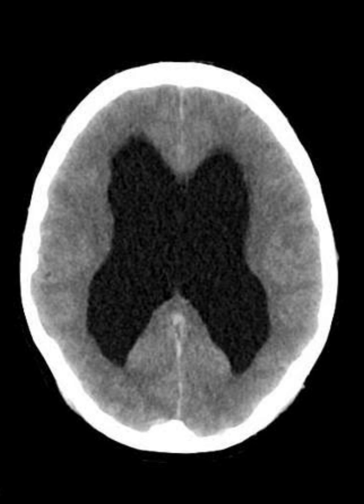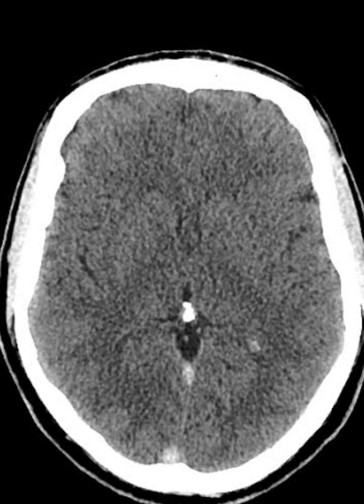Then, after the hydrocephalus, we have another CT scan, and that is a CT scan of cerebral edema. You can see that here you cannot appreciate the ventricles, and the whole brain is having light gray markings, which is basically cerebral edema, and there are no sulci at all, which shows that this is cerebral edema. You will come across this when there is raised intracranial pressure.